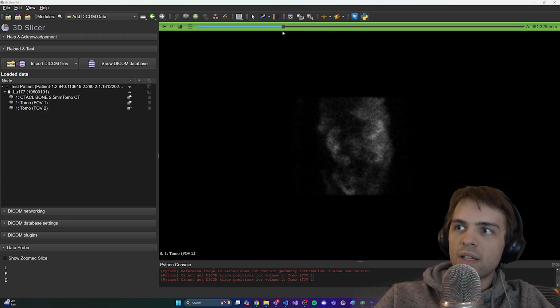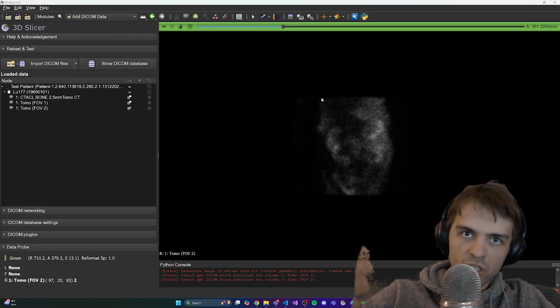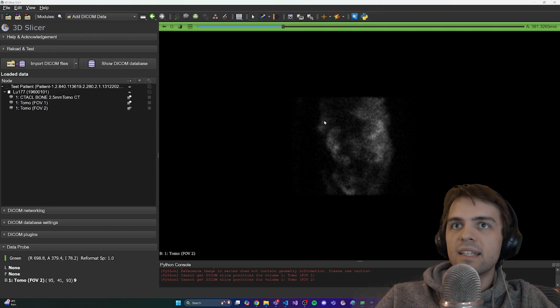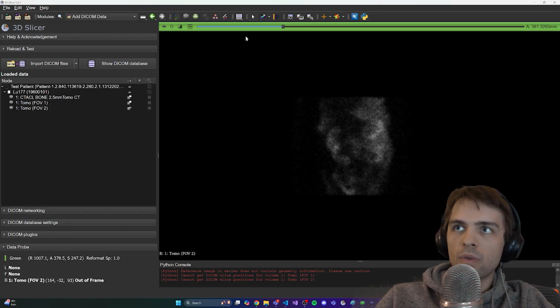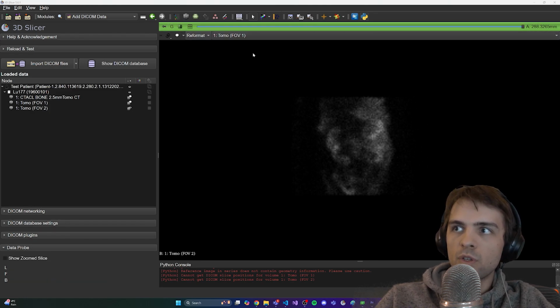And with the radioisotopes that they use, you get higher emissions at certain energies. In this case, they've collected 6 energy windows, and this corresponds to lutetium. Now, this is the lower field of view, but we can also look at the upper field of view as well.